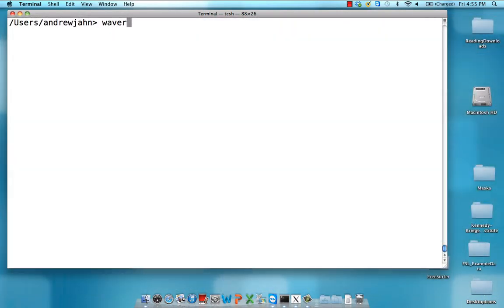The basic usage of waver is the command, and then dt. You could also do TR. Stick with dt, and that's your time step. So here it's going to be 2, so every 2 seconds. And we next supply a basis function, like a gamma function. And there we have a couple different options after that. One is called the inline function, where we specify when a stimulus is on and for how long. So here we could say we want a value of 1 at the very first time point.